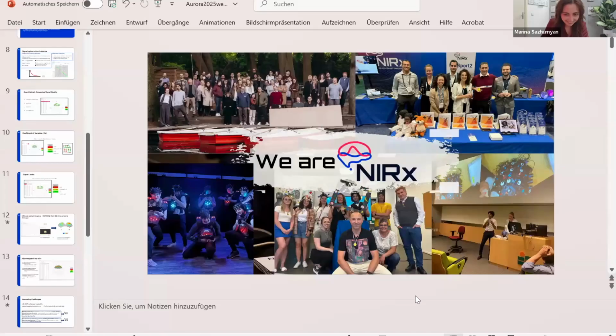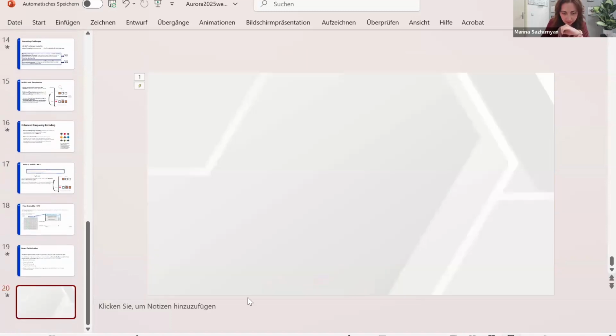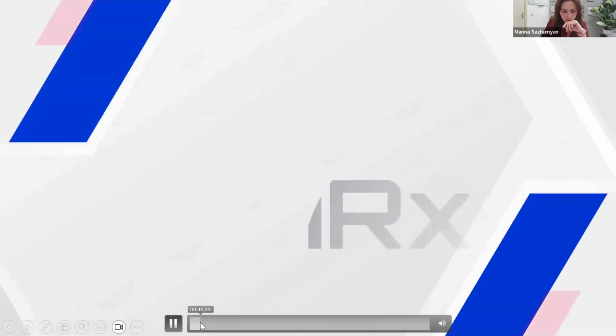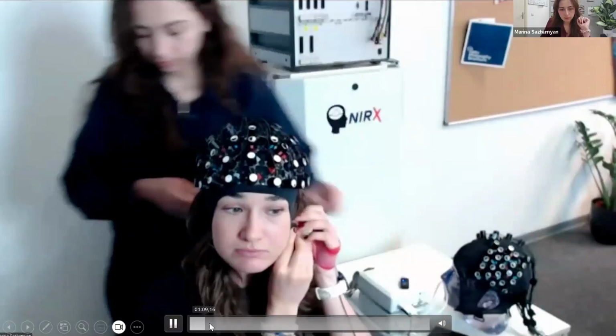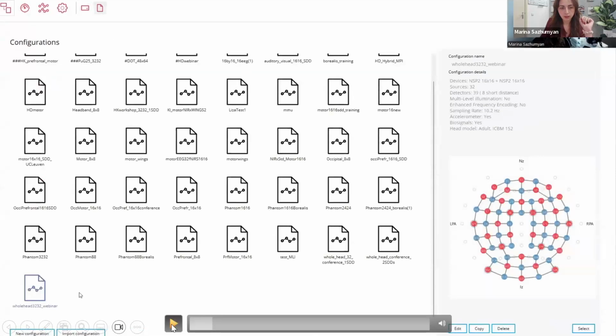Sorry. Let me go back to the video. Okay, I'm going to go back to this view. I just wanted to highlight the different configurations that can be created. Okay, let me just pause here.